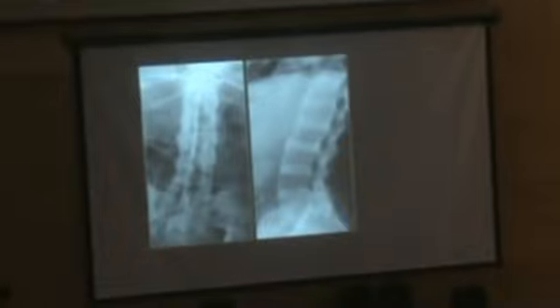But if we look closely in one of these levels, this level here, now it's easier because I have a spot, the level is there, it's the same level. Something's going on here, this is not normal. Especially that anteriorly, we don't see a continuity of the syndesmophyte here. There's a breakout, everyone could see that, okay?